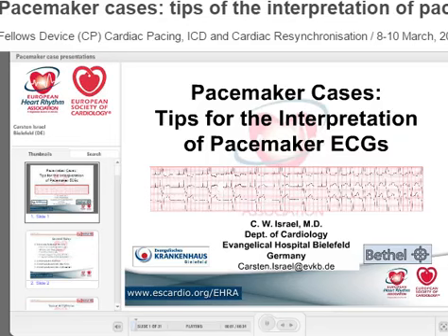Quick ride through everything you can see in different pacemaker devices from different companies, and it's pretty difficult because, first of all, algorithms, markers, and timings are a little bit different. And finally, also we have the good old ECG. That is what I personally love very, very much.